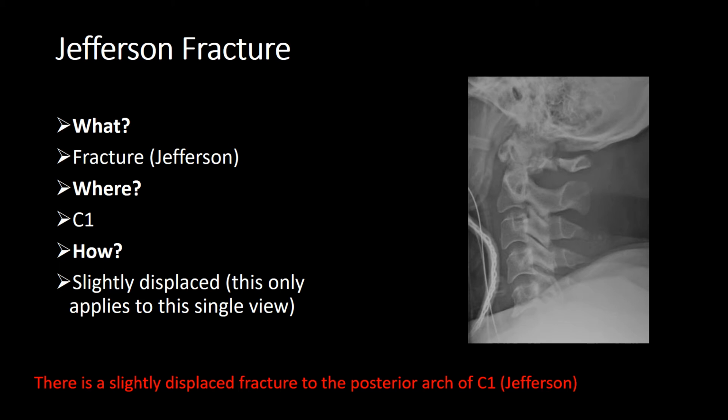Okay, S is for soft tissues. Well, unfortunately, due to the overlapping artifact, it's really difficult to see the soft tissue line. So in this image, we'll ignore that. A is alignment.